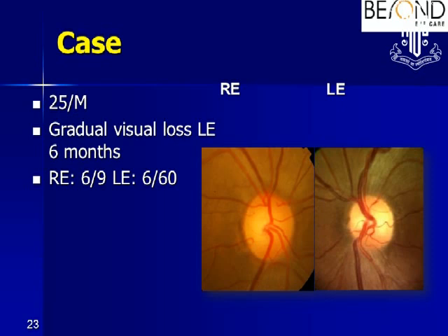Yes. Here the answer came in. It appears like a bow tie optic atrophy. So it appears maybe not very impressive, but it's fine. The poles look reasonably normal. The pallor is more on the nasal and temporal part of the optic nerve. This is described as band-shaped optic atrophy or bow tie optic atrophy. Any idea what could be the reason?